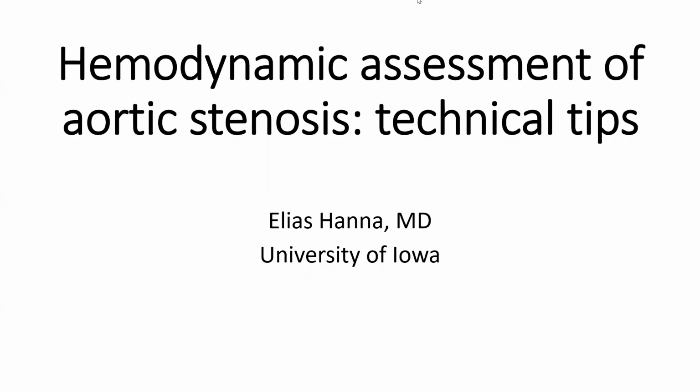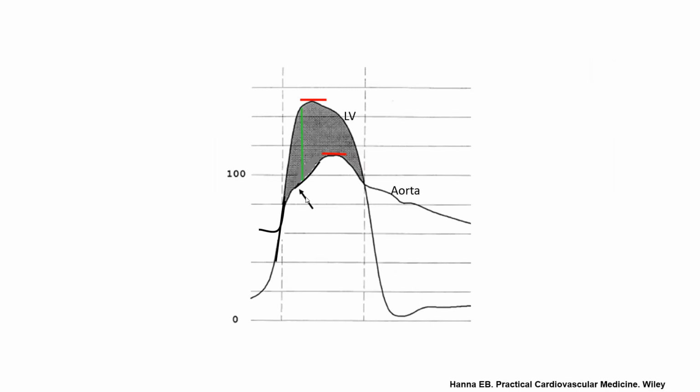So I'm going to talk today about the hemodynamic assessment of aortic stenosis. I will start with some basic slides, then it will get more advanced progressively. This is a simultaneous left ventricular aortic pressure recording in a patient with severe aortic stenosis.